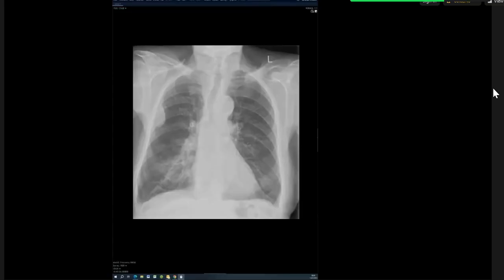Okay. So I am presented with a frontal radiograph of the chest. There is a right peripheral opacity abutting the right chest wall with an obtuse margin to the chest wall and some pleural thickening in that region. I suspect that this is a pleural-based mass.